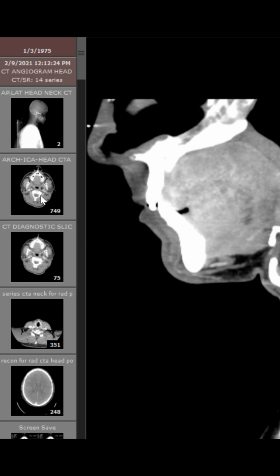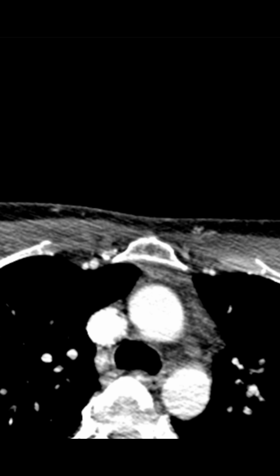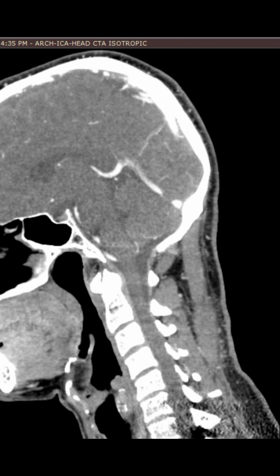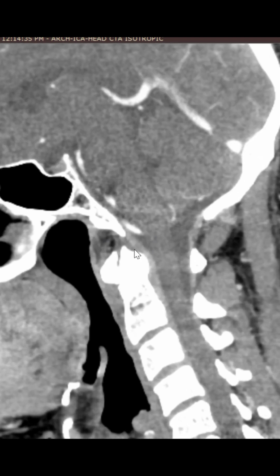So you come from there to click into the axial and then change again the multiplanar to sagittal, and then you can get your full skull picture. So if that ever happens on your CT angiogram or any CT scan, if they block out the sagittal portion, which is annoying, then just switch over to axial and then change it over to sagittal.